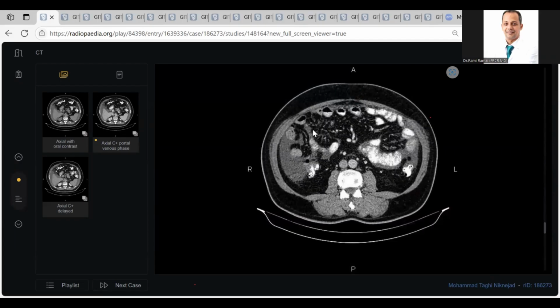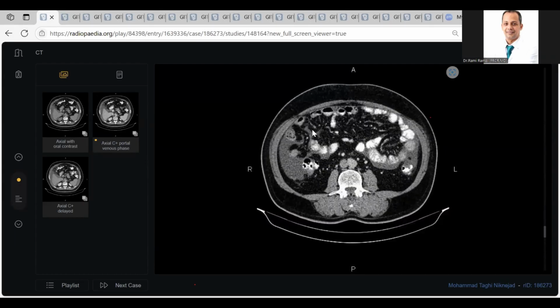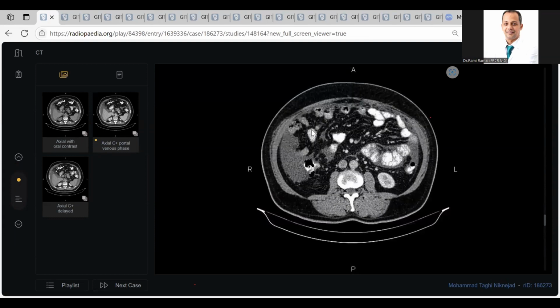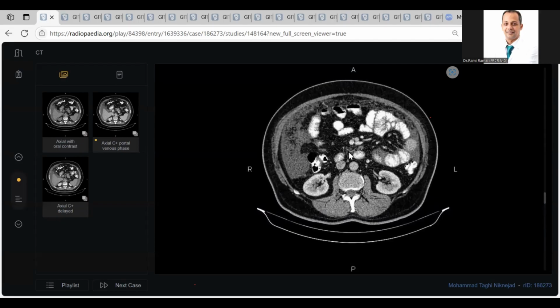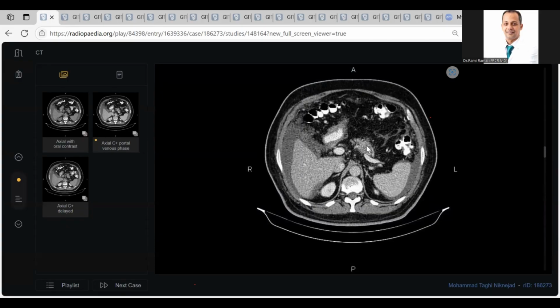Sir, this is likely a case of pancreatic carcinoma with widespread mesenteric metastatic deposits. I would convey my findings to the referring physician. I would advise a cytology tap correlation, and also refer the patient to surgical oncology for further workup, as this lesion cannot be approached via an ultrasound-guided or image-guided approach. Also, I would advise correlation with the CA 19-9 levels.